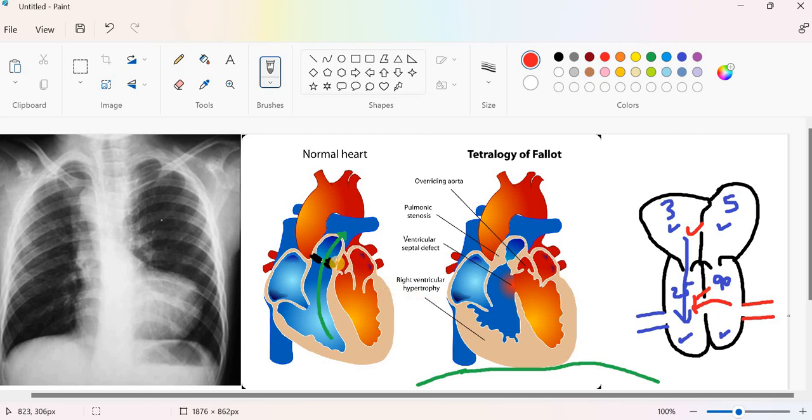This pulmonary stenosis that I discussed might be a part of a very well-known syndrome, which is Tetralogy of Fallot. Tetralogy of Fallot means that we have 4 features in the newborn baby, one of which is pulmonary valve stenosis that with time will make this ventricle suffer. As you see here, the thickness of the wall with time is getting thick because it has to push against an obstructed or stenosed valve. So pulmonary stenosis with time will lead to right ventricular hypertrophy.